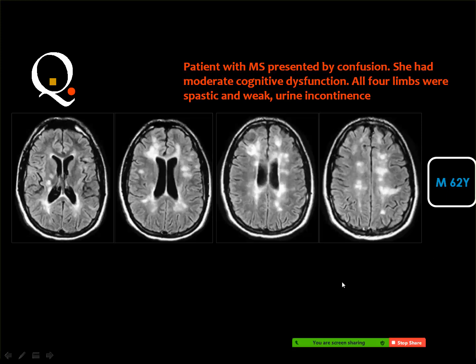And subcortical arteriosclerosis. No, did you read the history?